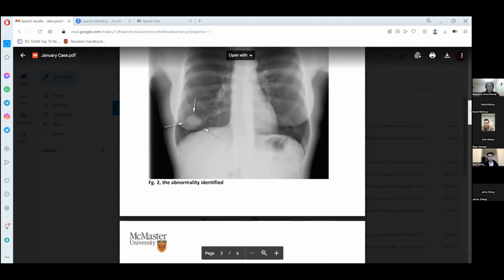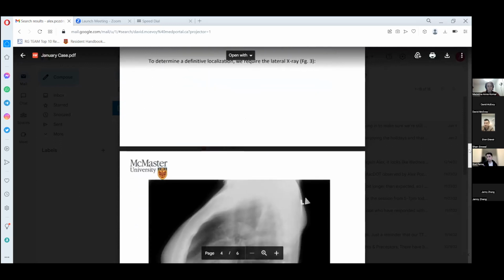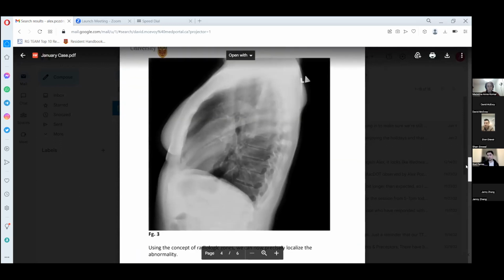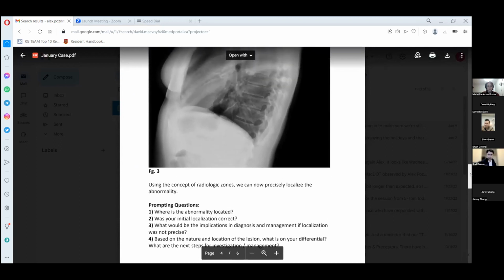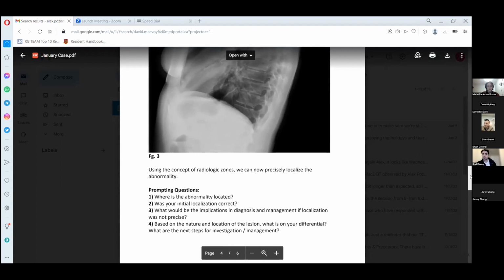It's very difficult to say exactly whether this is a pneumonia. In fact, this looks more like some sort of mass. But there are situations where pneumonia can be caused by an underlying tumor, especially in older patients. That's why it's very important to get serial follow-up. Once you get your initial radiograph, clinically, it's important to get another radiograph in 4 to 6 weeks to ensure that whatever you did to treat your pneumonia actually resolved everything, and there is no mass that caused this pneumonia in the first place.